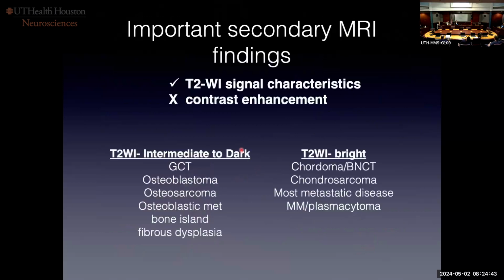All right, important secondary findings. I'm sure there are going to be people who are going to disagree with me. I seldom find contrast enhancement to be helpful in forming my differential diagnosis. The T2 weighted images can be helpful if at the extremes.